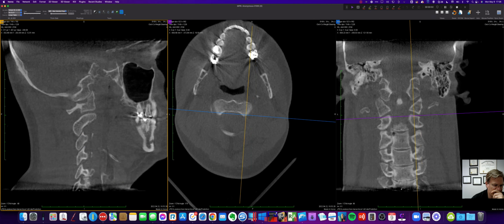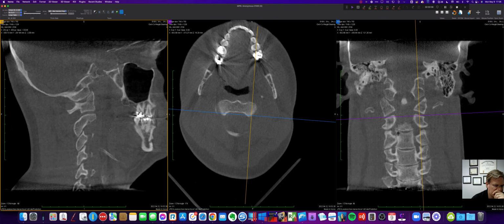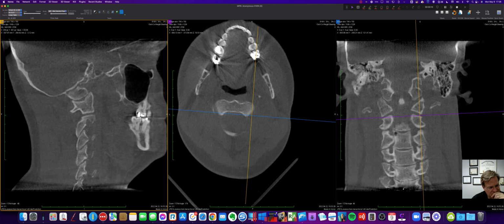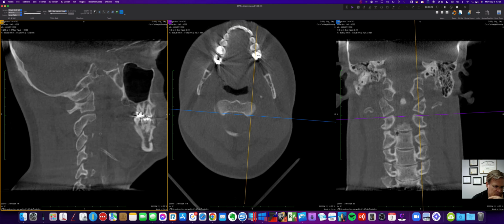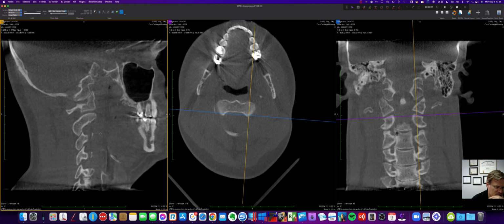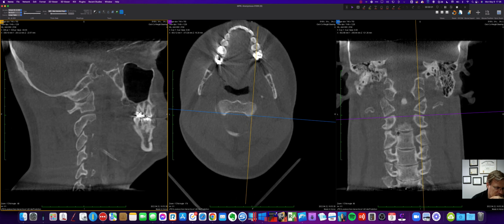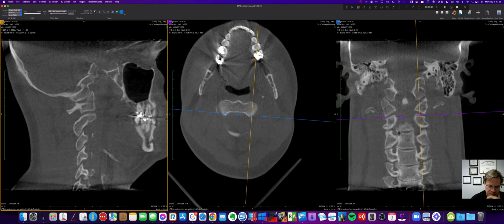Now, if I'm just going to go back and forth, nothing going on there. We got an anterior wedge, which would seem to indicate a posteriority, but it doesn't look like a posteriority to me. This one certainly could be a posteriority, not really a wedge, is kind of a deformation of the joint.